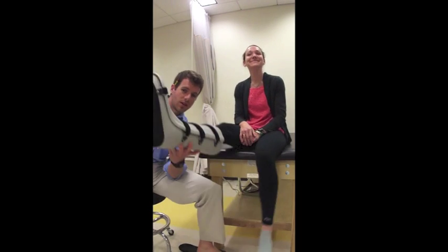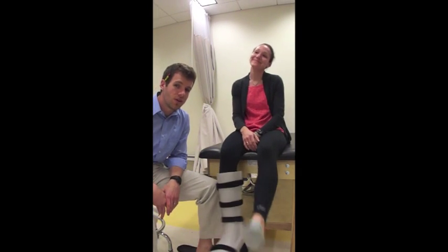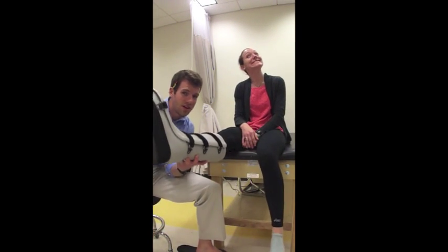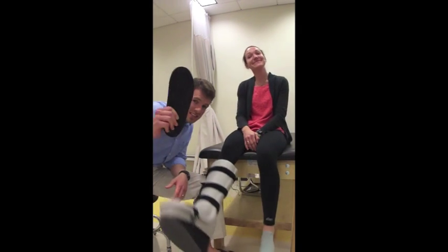What happens when your orthotic doesn't have a knee joint? First of all, we don't care because it's not a KFO. Next, it's not an orthotic. This is an orthotic.